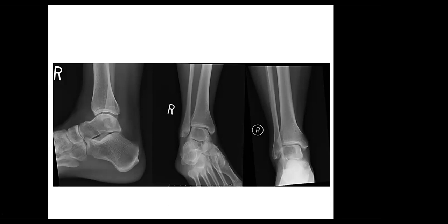This is a skeletally mature patient with a subarticular lesion. From the bone tumor talk, the differential for subarticular lesions depends on the patient's age. In an adult like this patient, we would think more giant cell tumor, just like you said. And in a child, we will think of aneurysmal bone cyst. We'll think of chondroblastoma.